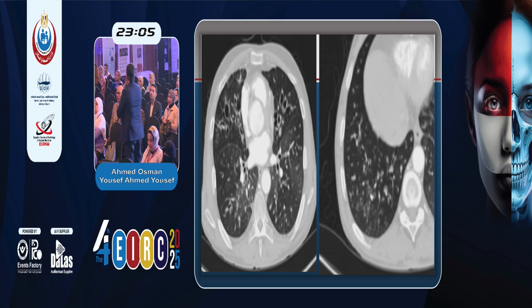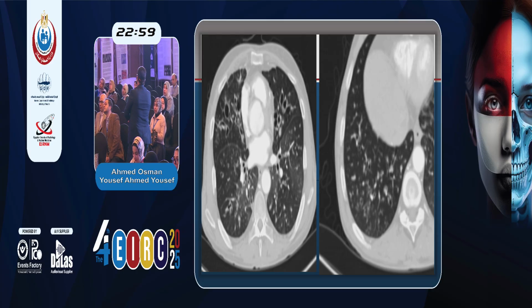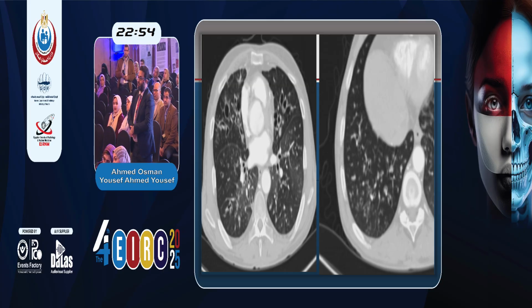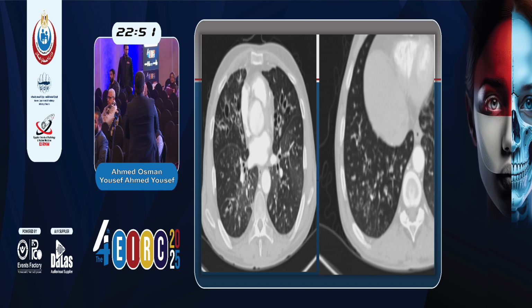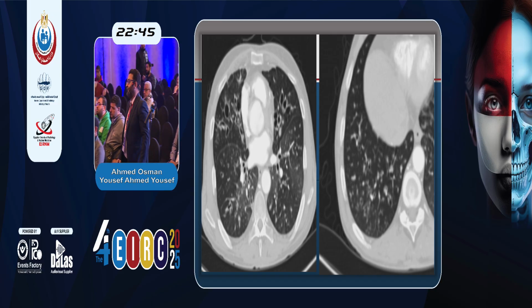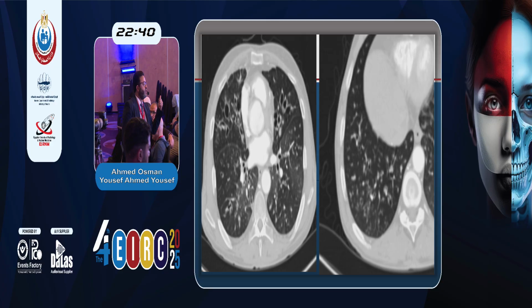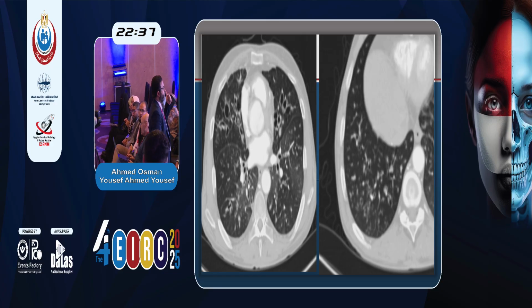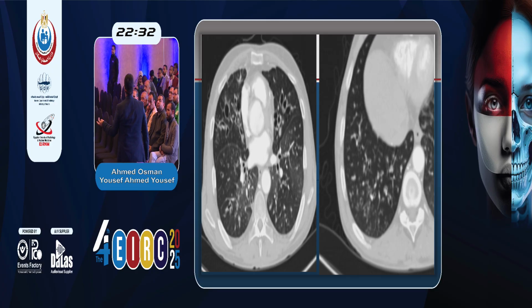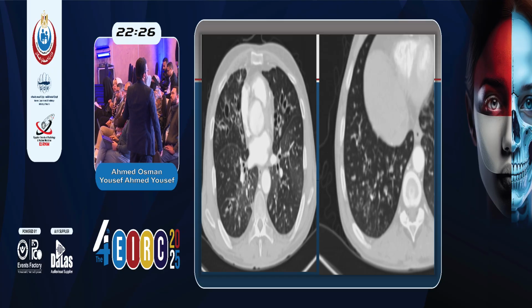The second image, in the lower lobes, the ground glass. Yes, and someone said tree-in-bud. Yes. Okay, so we have three findings here: bronchiectasis, tree-in-bud, and ground glass. And this bronchiectasis explains the chronicity of the patient. The patient is coming with repeated attacks of hemoptysis and repeated attacks of infection, high-grade fever, and greenish sputum, and this mostly explains the chronicity of the patient's complaint.